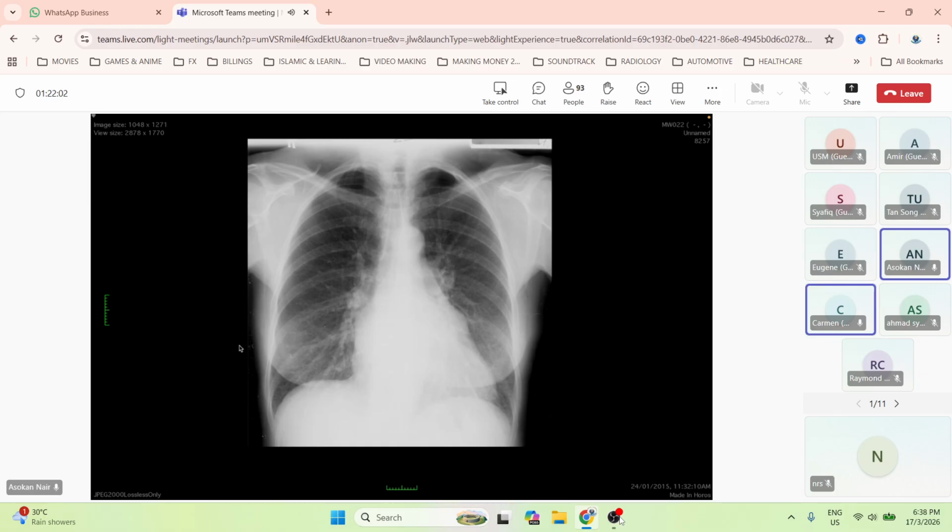So you've heard of the four moguls, right? This is the third one. Then the fourth one is the left ventricle. Now they're talking about a fifth one, the cardiophrenic angle. If there's something else bulging out here, maybe a pericardial fat pad or pericardial cyst. But typically there are 4.